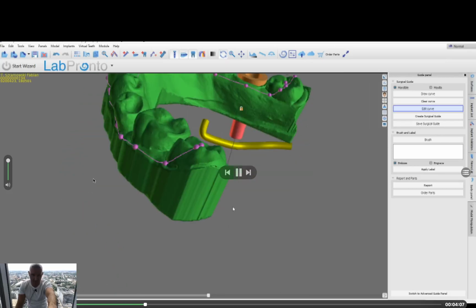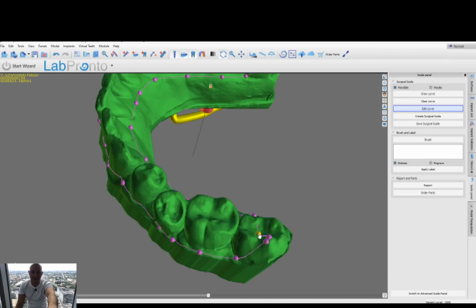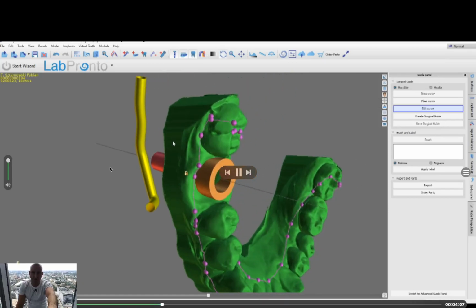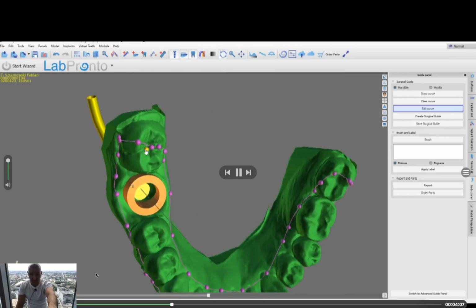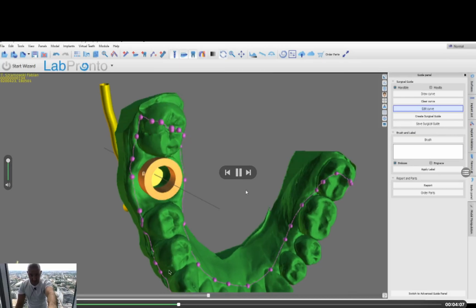You do not need to prepare your template for the entire teeth arc. Okay, now you can edit your curve, so you just move those points here if you think something is incorrect. So I adjust it a little, and after that here is the option.